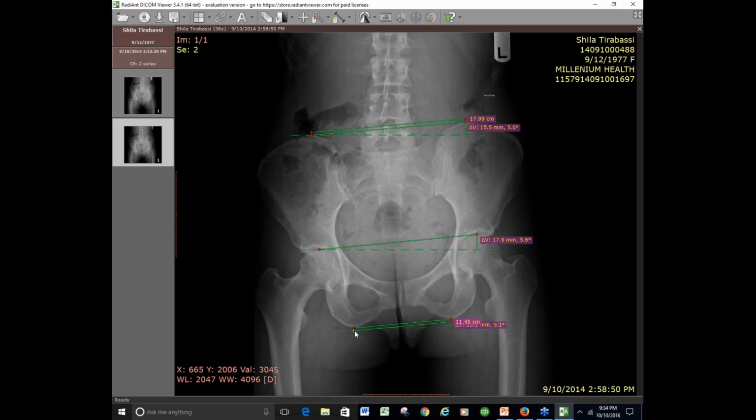Then you're actually going to have to take another measurement, right? And go, okay. Get that out of the way for right now. And measure this and measure over to that, right? And that's 11.4. That's my A squared, right? And that's my B squared.